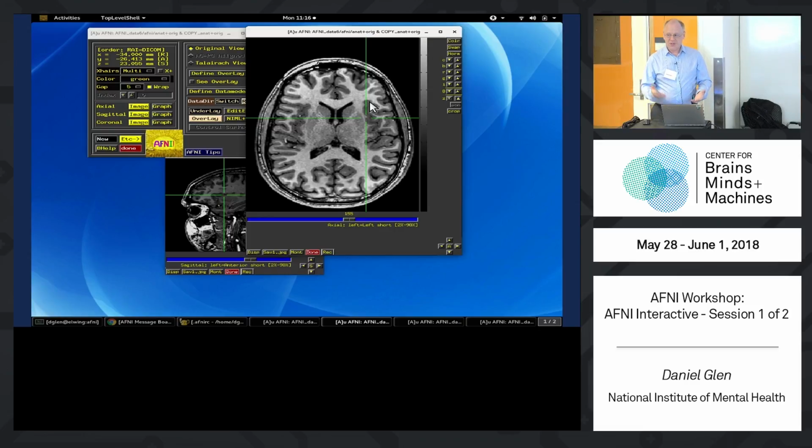One of our AFNI users used these tools that we're going to show you today in the AFNI GUI, and they said, look at this, it doesn't look like it's aligning well. But if I flip it, it looks better. So we integrated that idea into our alignment script, and so now we can do this automatically. And now afni_proc does this automatically for you too. So it will tell you, does the flipped version match better? If it matches better, we don't know which one's which, but the left may not be on the right. You will have to go back and figure out which one is the left or the right.